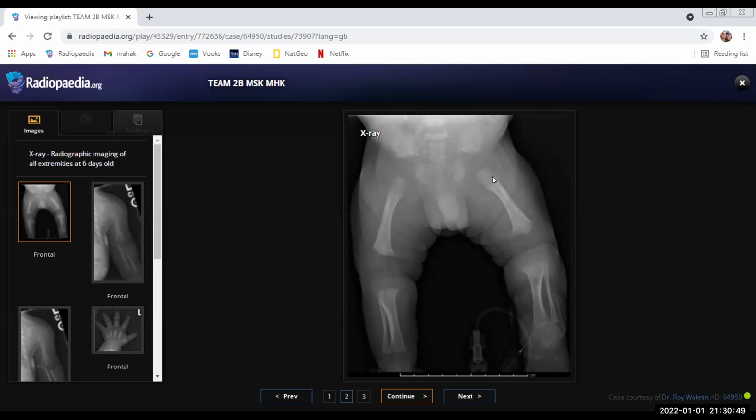So I would discuss it with the clinician and give the prime differential of achondroplasia. Also, there is the visualized sacrum. There is narrowing of the interpedicular distance as it goes down. So achondroplasia, and the patient would be referred to a specialist pediatrician for management.